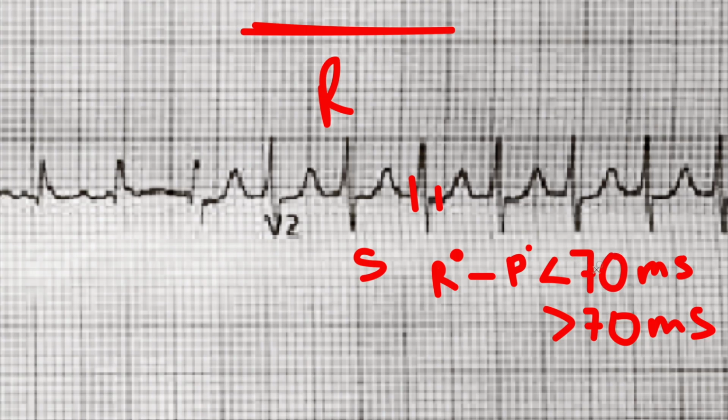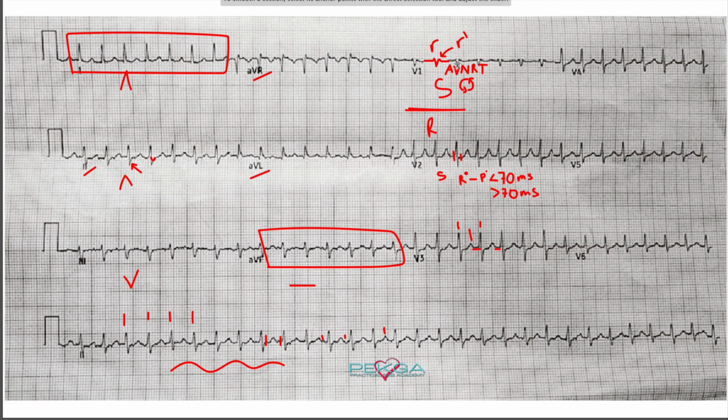Okay, there's flexibility here, and there's actually quite a bit of flexibility. So when you go out into literature, these numbers can easily go up to 90 milliseconds. And even there's room for movement. So this is just one of the tools that we use when it comes to trying to differentiate, just using the ECG, right? So here we're not talking about invasive methods.